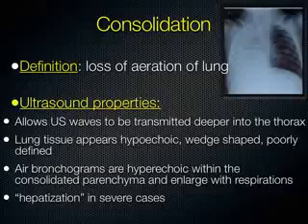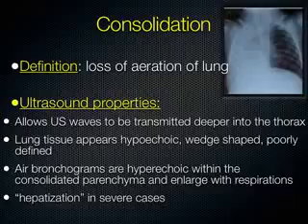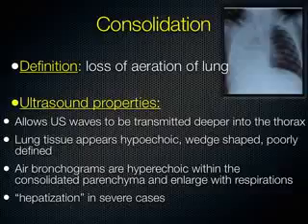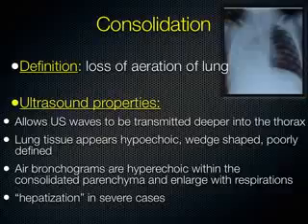And inside the lung tissue, things have different echogenic properties. For instance, the bronchi have more connective tissue in them, so you're going to see brighter white lines for bronchi. If the lung is severely consolidated, it will actually end up looking like liver. We call that hepatization of the lung, which is just a term meaning it's really socked in. Pneumonia almost looks like a solid organ, and those patients are generally in pretty serious trouble.